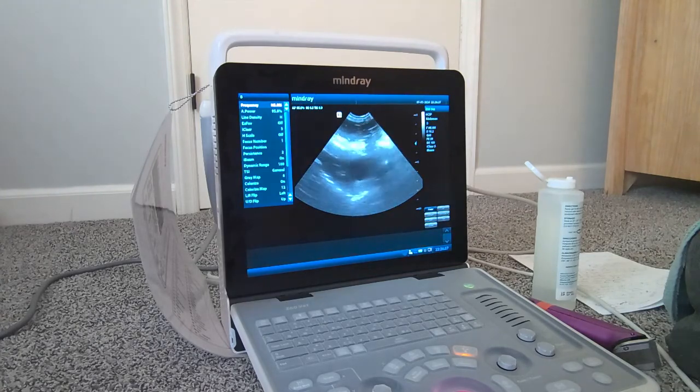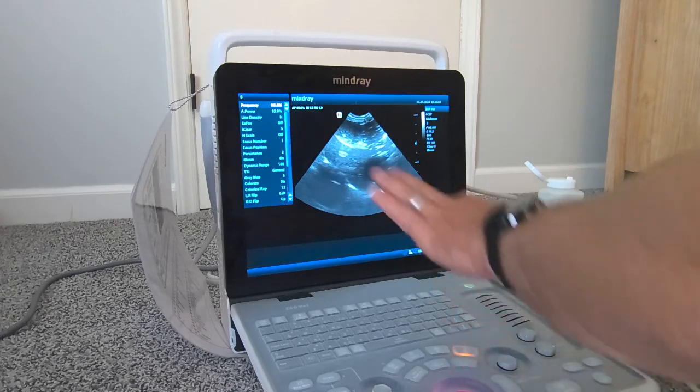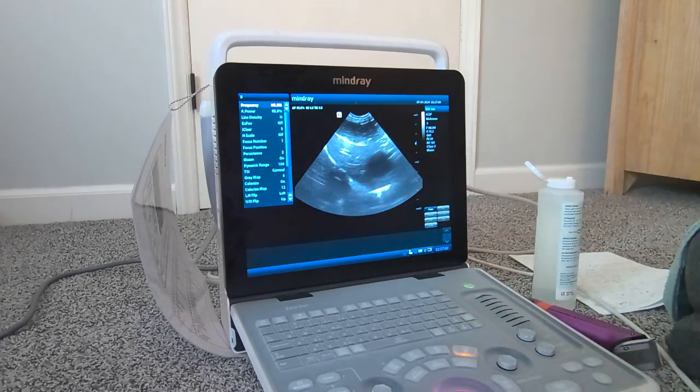So when we're looking at the different lobes of the liver, unfortunately, we don't normally get to differentiate the lobes because they're all adjacent to each other, and there's not much of a difference in their acoustic impedance or their ability to send back our signals to us. So I don't see the different lobes. Sometimes you can see lobes, though, if there is a bunch of abdominal effusion. Then sometimes we see the fluid going in between the lobes, and you can actually see it. You should also look at the liver lobe margins.